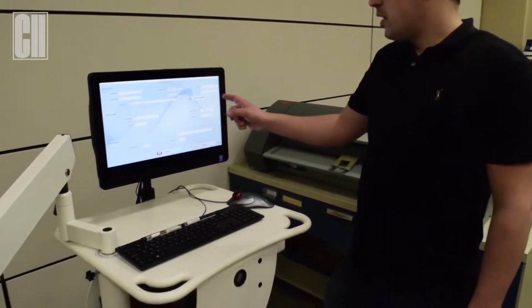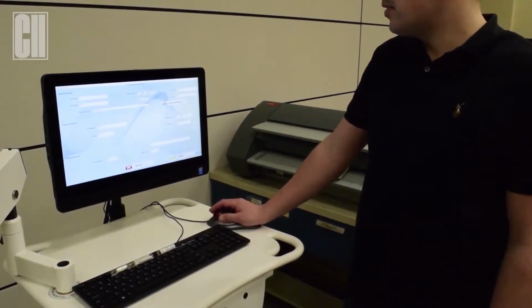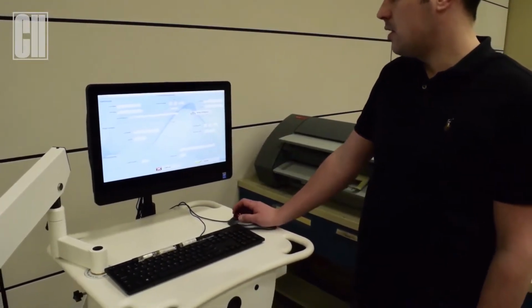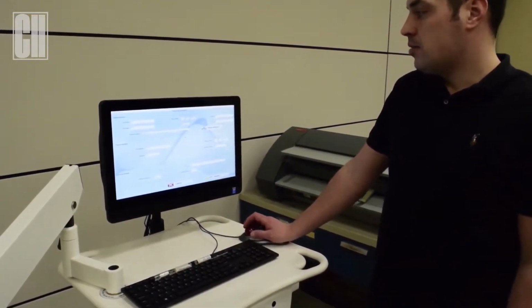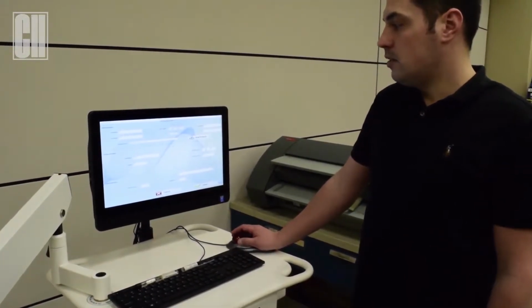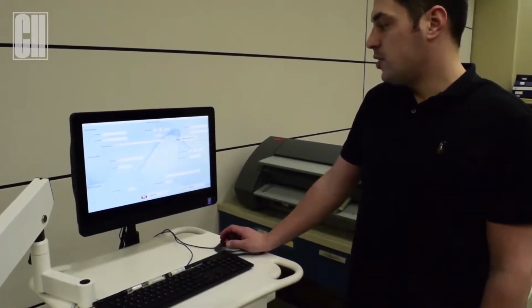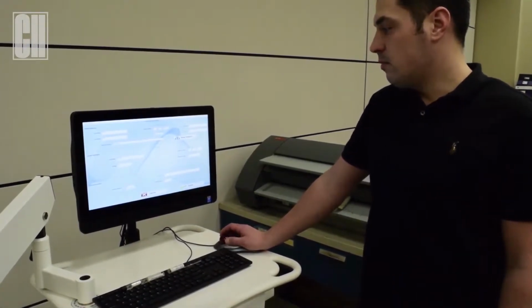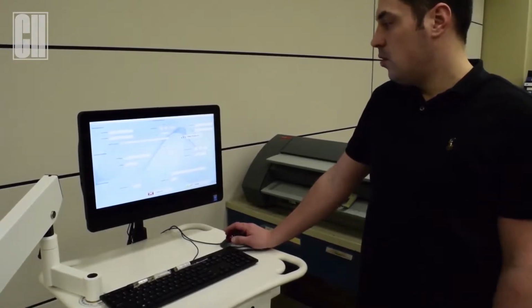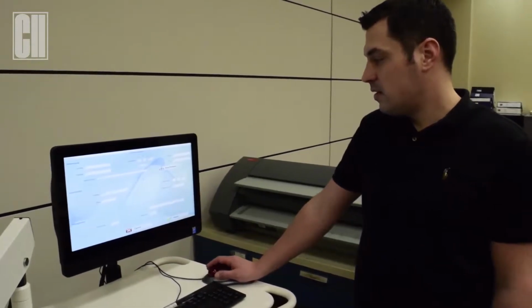The top section is going to be our patient information. This will have the patient name, the date of birth, the sex, the patient ID, and the physician. This middle section is our dose information for our capsule: the activity of the dose, the date of the calibration, and the calibration time. The calibration time would either be referenced off of the label, or if you're to measure in a dose calibrator, and this is based on the 24-hour clock.